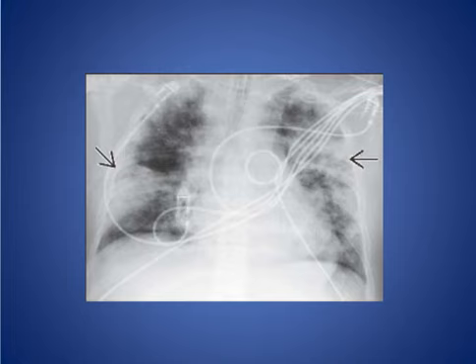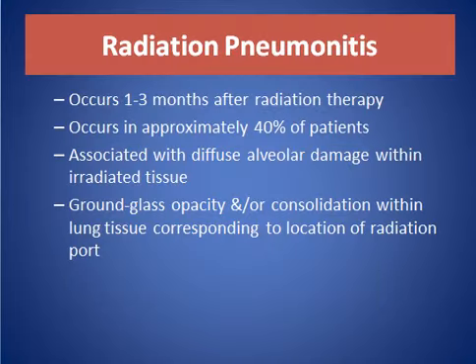Here, patient with chest X-ray with bilateral peripheral airspace consolidation in patient with acute respiratory distress syndrome. And this is sometimes difficult to differentiate from cardiogenic pulmonary edema. But in cardiogenic pulmonary edema, the central part is involved. Here, it is not involved.